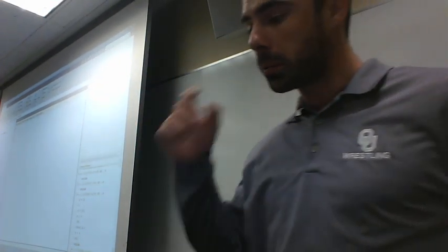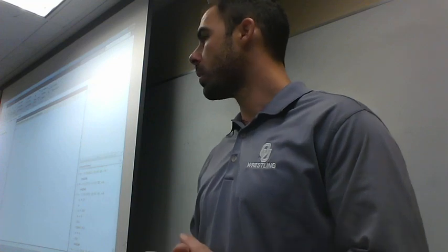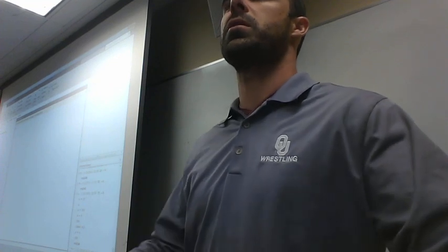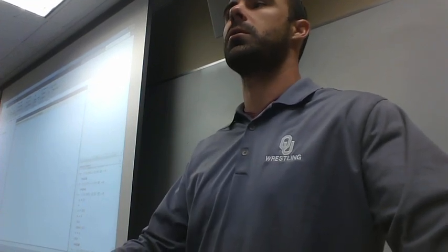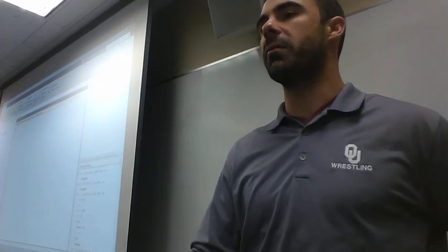So you should already be in the folder and installed type EEG Lab Methods. Okay, so is everybody doing okay getting set up? All right, remember you want to open up EEGLAB, or excuse me, MATLAB first.